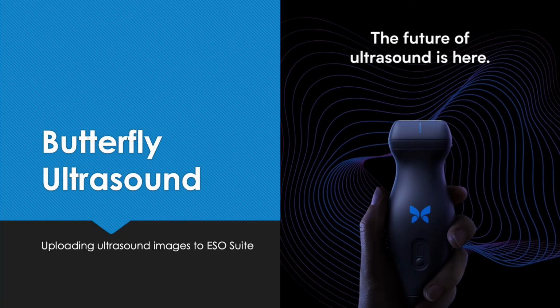Okay, today we're going to talk about uploading your files from the Butterfly app to your ESO reports. So far, we've seen a lot of good attempts at getting good slides, good images from the ultrasound. We want to make sure that instead of just documenting we did an ultrasound, we can actually attach the files to our reports so that the doc can view them, we can view them, as it relates to your particular call. So let's begin.